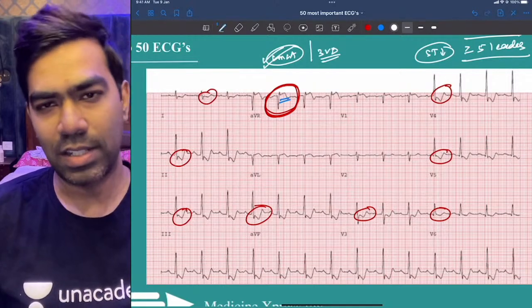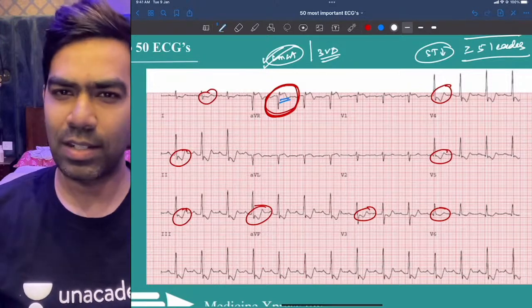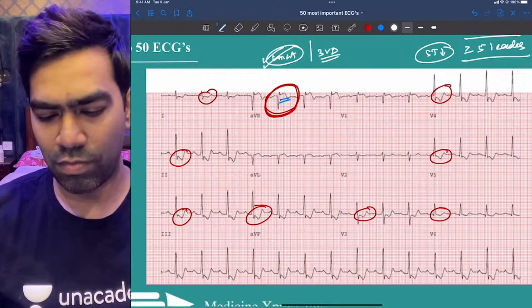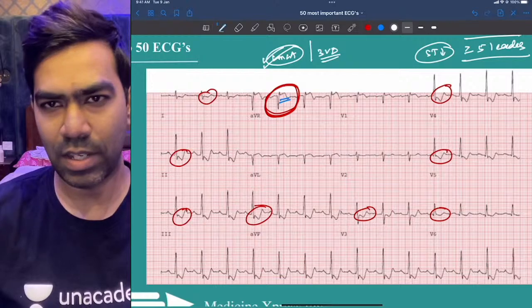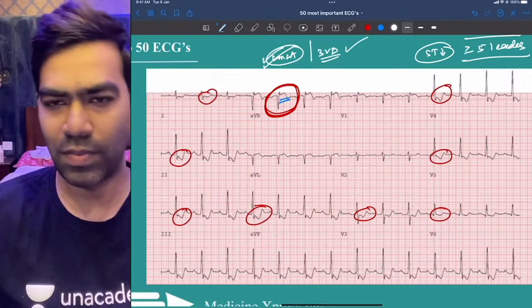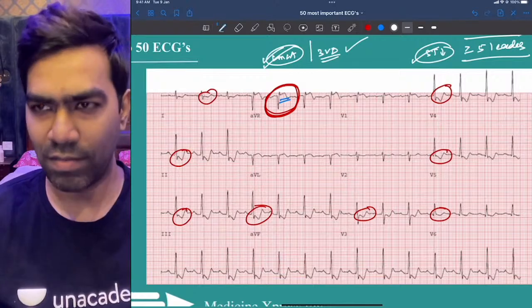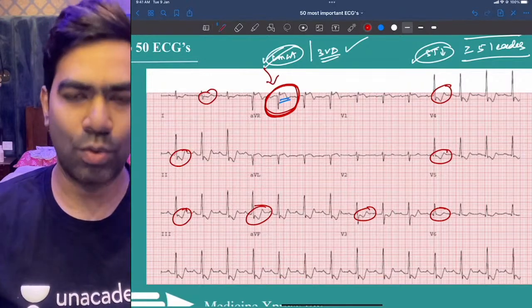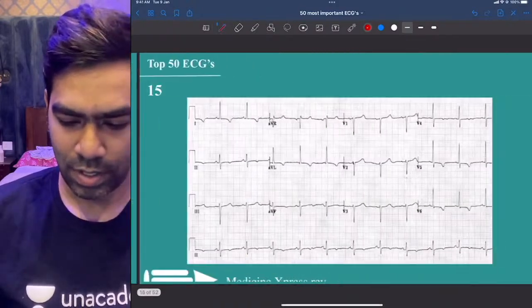This is a kind of severe stenosis of left main coronary artery, or you can see this pattern in NSTEMI also or NST-ACS also, but I'm going to diagnose more of LMCA stenosis in this condition, or a critical LMCA occlusion, or we can even diagnose a triple vessel disease based on this EKG. So remember, ST segment depressions in more than 5 leads along with ST elevation in lead AVR is more suggestive of LMCA disease and sometimes a triple vessel disease as well.